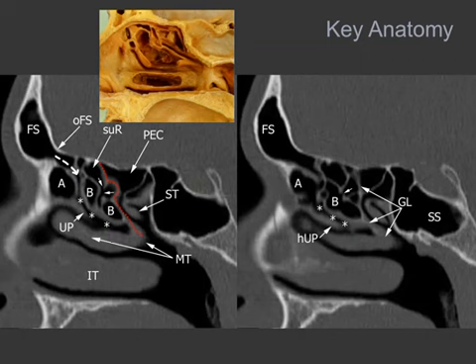Behind the ground lamella, the basal lamella of the middle turbinate, is the superior turbinate, and in front of this structure there is the opening of the posterior ethmoid cells, and behind there is the sphenoid sinus. This is the area where the cells coming from the posterior ethmoid sinus and the mucus coming from the sphenoid sinus will empty in the superior meatus.